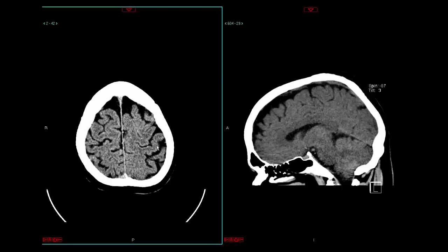On the left side here, the post-central sulcus that we see makes a T-like intersection with this sulcus. And this is the intraparietal sulcus here on the left that you're seeing. So the intraparietal sulcus is going to differentiate your superior parietal lobe from your inferior parietal lobe.